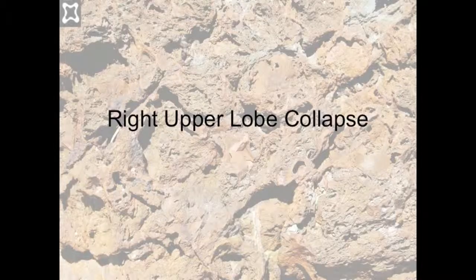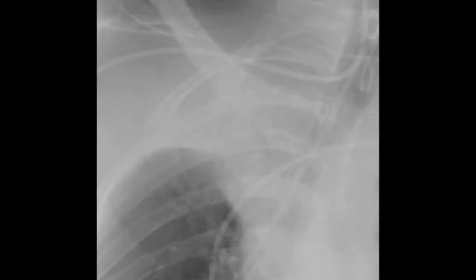Collapsed lung varies in appearance depending on the lobe. However, in general, the appearance is homogeneous with no evidence of bronchial shadows. The right upper lobe collapses towards the trachea, resulting in the appearance of an upside-down equilateral triangle, the apex of which is at the hilum. Medially, this obscures the tracheal border, while the inferolateral edge is formed by the horizontal fissure which is displaced upwards, as is the hilum.